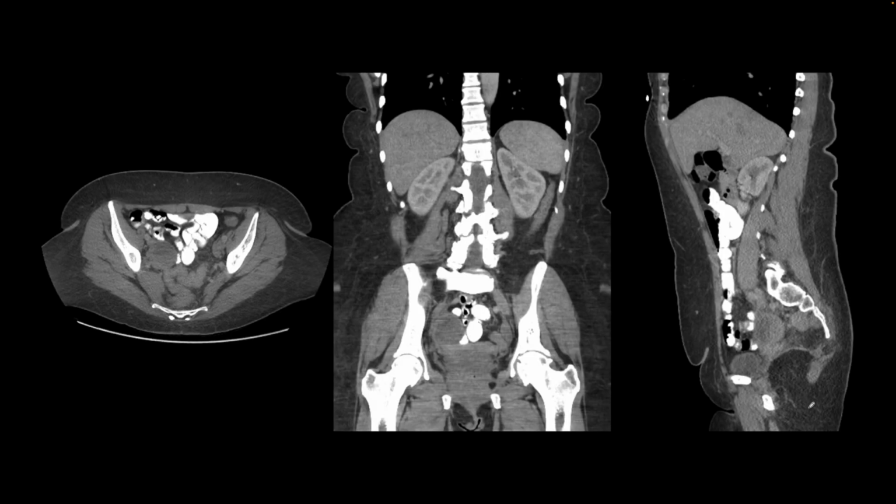This is our next patient, a young female who presented with abdominal pain, and we see this very frequently where a hemorrhagic ovarian cyst is a cause of severe pelvic pain. And so here we find an ovarian cyst in the right adnexa, and it shows that hematocrit sign that we saw earlier, where denser components are in the posterior aspect, and it's more cystic in the anterior aspect with a pretty well demarcated line here, which is the hematocrit sign.